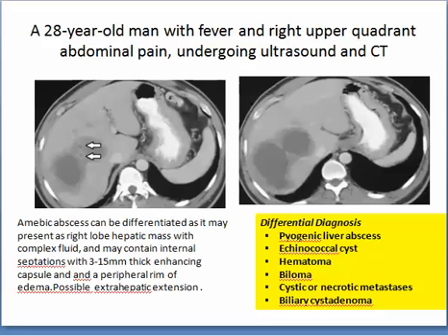liver abscess. Multiplicity, right liver lobe, thick walls 3 to 15, enhancing, maybe with internal septa inside, like this or that, and a peripheral rim of edema causing ill definition of the margin with possible extrahepatic extension. Calcification may occur.